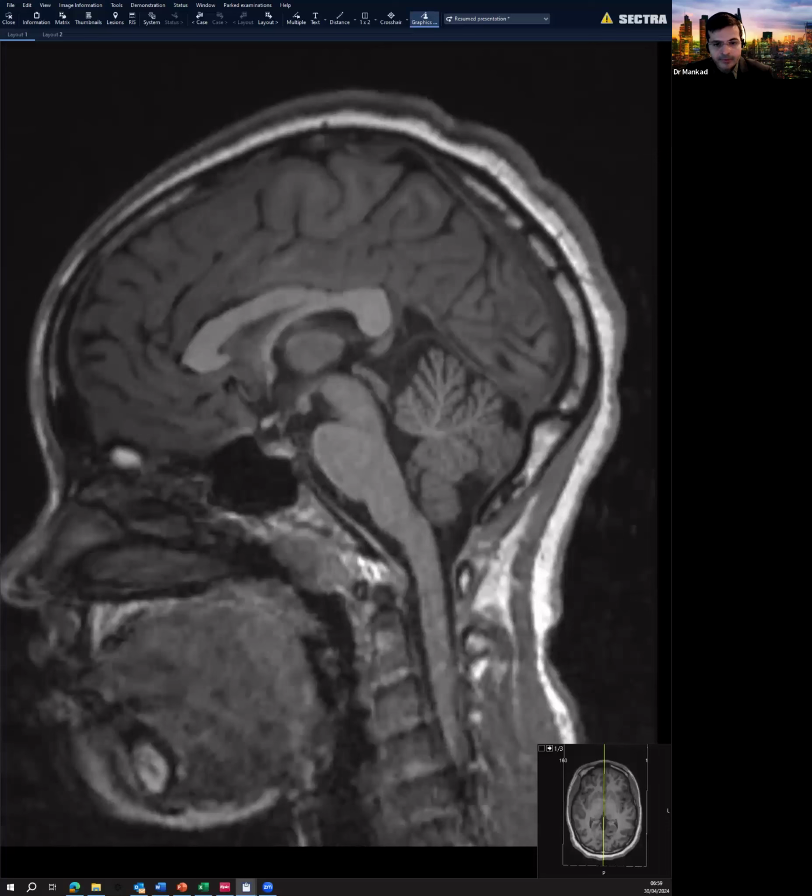Let's get some answers on the chat room here. Exactly. So you are right, Dr. Yani, Dr. Hussein, and I'm sure everybody gets it: sagittal. And we are here at the level of the midline sagittal plane. Okay, this is exactly the midline.